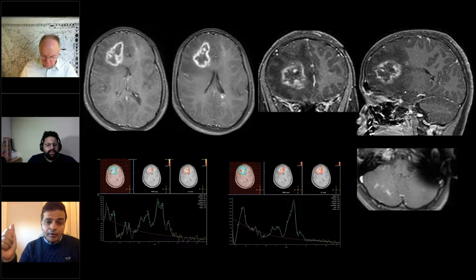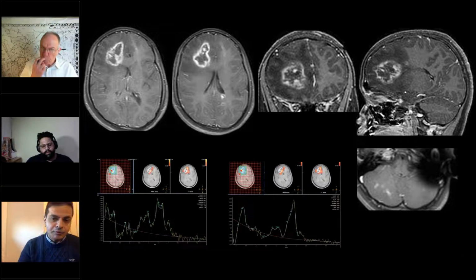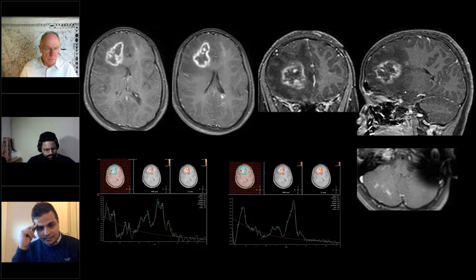So no fever, relatively well, and you have a COVID status that's positive with multiple calcific lesions in the brain. I generally look for a unifying diagnosis. You can have more than one possibility, but clearly we have an answer here, so we should proceed to that. I don't think I can offer any more differentials at this point. Yes, so biopsy as well.